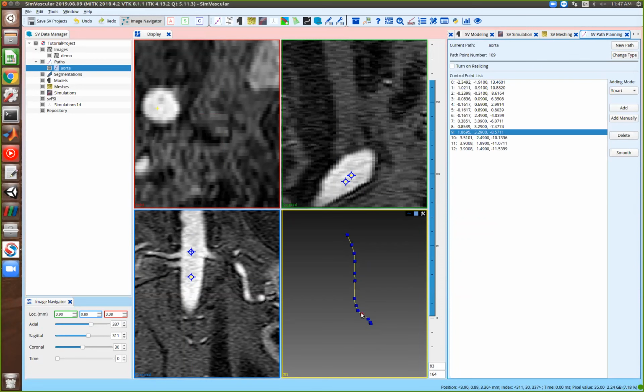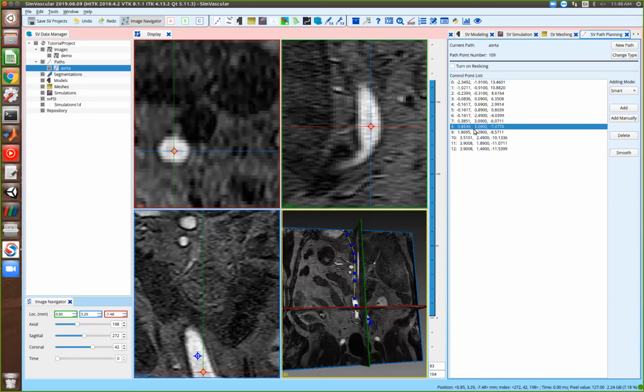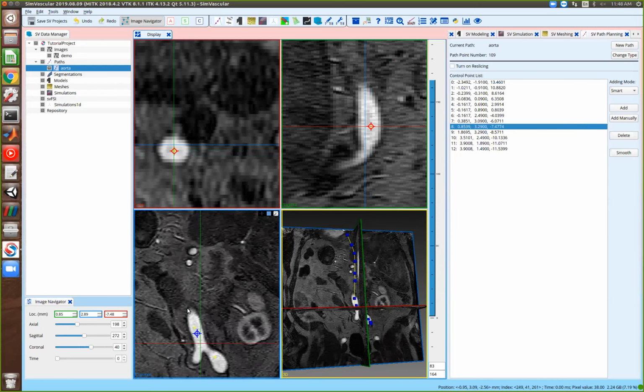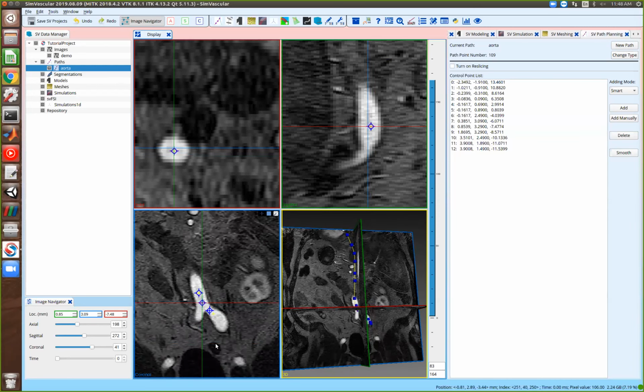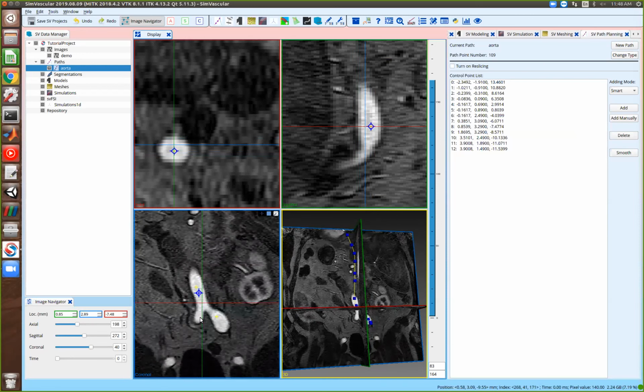Okay, so we're going to go ahead and focus on the right femoral artery, which again, we didn't do in our split down here. So I'm going to show crosshair and go down, use clicking on this to jump to where the split was approximately, and that's around here. So we followed the left femoral artery down, but there is this artery that goes to the right side of the body. And if we wanted to model that, we would need to create a path line for it too.